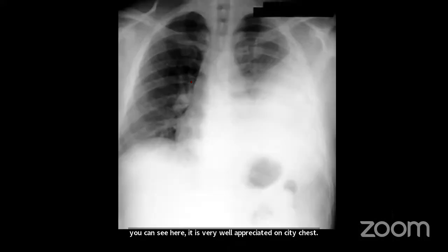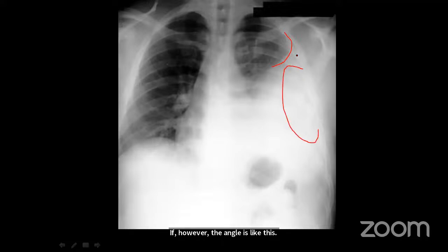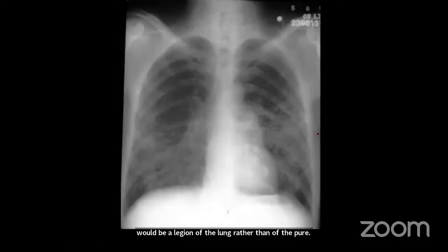Here you see a right pleural effusion, left pleural effusion, huge effusion. And how do we know whether this shadow is from the pleura? You have to see the angle. If it is an obtuse angle, it is from the pleura. If, however, the angle is like this, suppose the fluid is like this, this angle is actually an acute angle. In such a case, it is actually a loculated collection, and mostly it would be a lesion of the lung rather than of the pleura. It will be a mass lesion or consolidation.